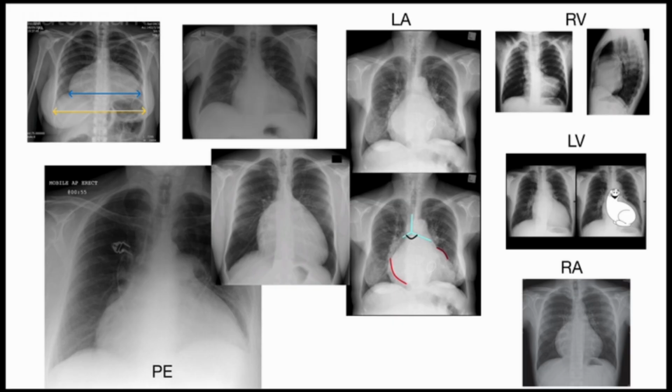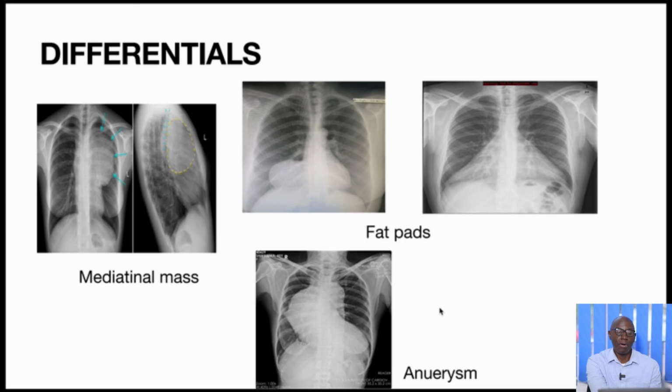But I must say that most of our patients come in late, so sometimes we don't get this, because when one chamber fails, it leads to failure of the other chamber and dilatation, and most of the time we get a globular heart. We get gross dilatation. So this is a patient who you want to send for a checkup, maybe an echocardiogram. We need to see and we do an echocardiogram.